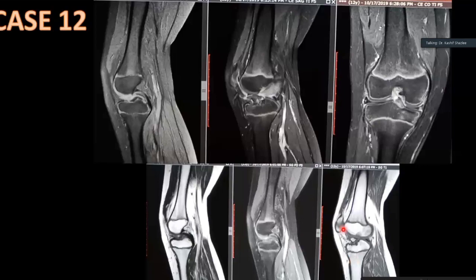There is a fracture of the tibial plateau. There is associated partial acute tear of the ACL. There is double PCL sign representing bucket handle tear of the medial meniscus. And if you can see here on coronal image, the tear is also visible. Yeah, okay. Meniscal tear. Okay.